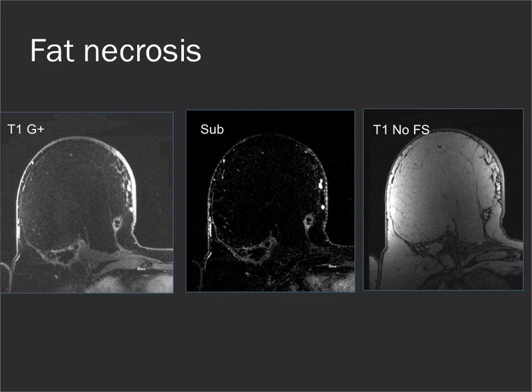Now, this is a patient who has had a TRAM flap reconstruction, and we tend to see a lot of fat necrosis in these patients. It can be a real diagnostic problem on occasions, and they can feel very ugly when you palpate them. You can see here on the T1 gadolinium enhanced images and the subtraction images that this kind of rim enhancement is spiculated; it looks nasty.